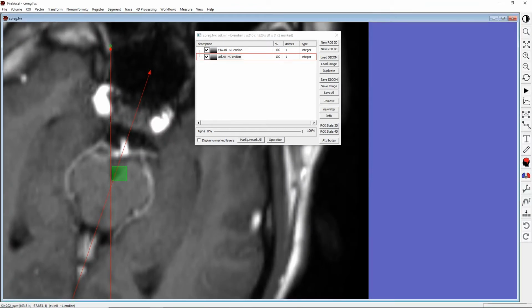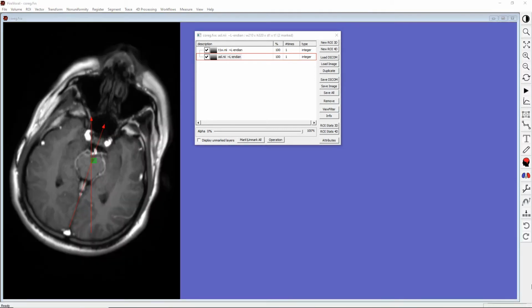Right-click and drag these vectors so that they intersect at the common landmark, which will be the center of rotation. The angle between the two guiding vectors shows how much we need to rotate the ASL image counterclockwise. Again, these guidelines are helpful, but not required for the next step.